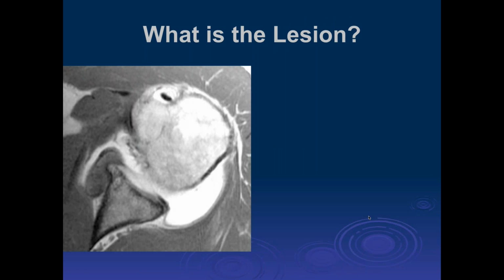Well, there is low intensity signal in the anterior capsule, but I don't see the labrum very well. I'm not sure what the name of this is.